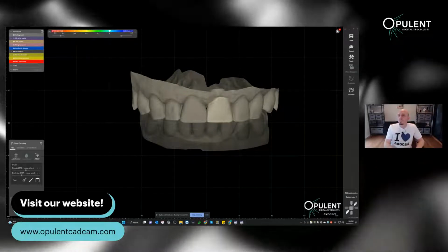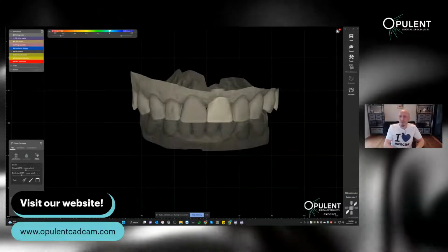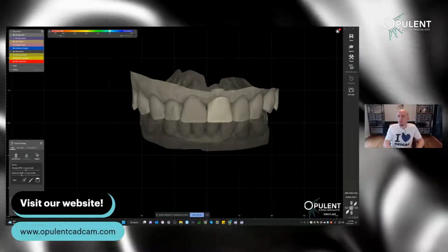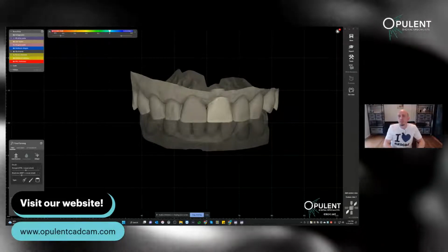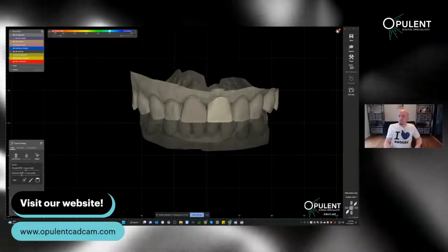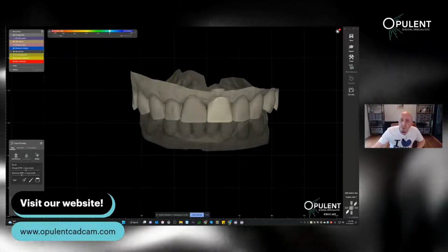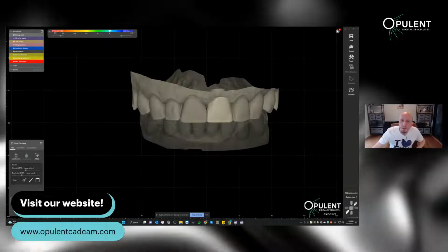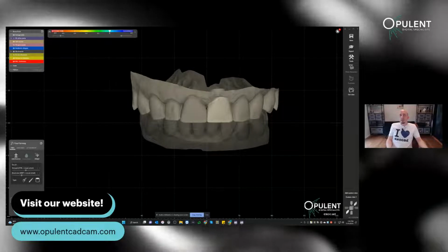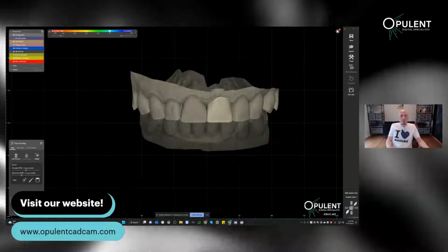I will tell you a little bit about Exocad. You probably already know it in and out, but maybe there's a couple of people who don't. There are always new followers, new people buying equipment, and not everybody knows it. And today, as you saw in the intro, we're going to look at the implant module. So what's new in the Rijeka version?